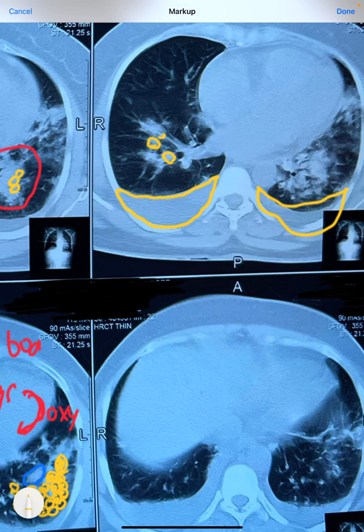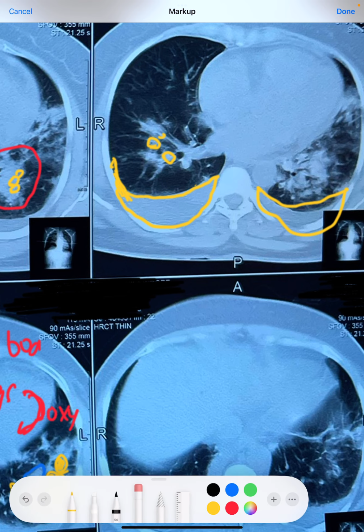That is the reason this is taking the shape of the chest. This has organized around the lung borders. It means it is in the pleural space. It has a crescent-shaped, moon-like structure. It has the expansion, or it is going around the lung borders. So this is pleural effusion and this is not consolidation.